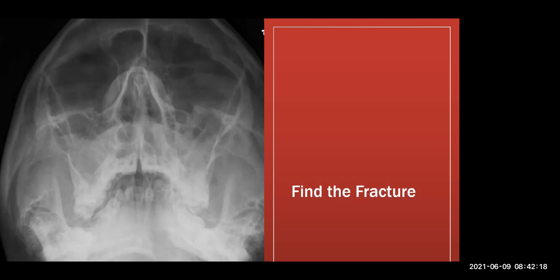All right. So this one here, you can see this is an OM30, right? Which means that they are looking more at the bottom edge. So we're not going to worry too much about line 1, but let's look at line 2. Line 2 in the OM30, you can still follow it quite a bit, but look around it. What do you notice? Do you see anything? Not really. But here's a patient who's sitting in front of us with severe pain, not feeling well, severe swelling and things like that. So let's go to line number 3.